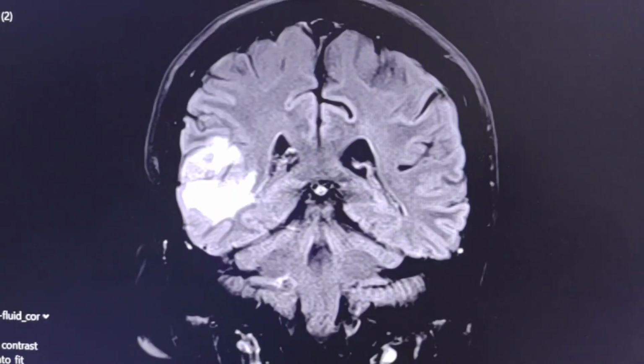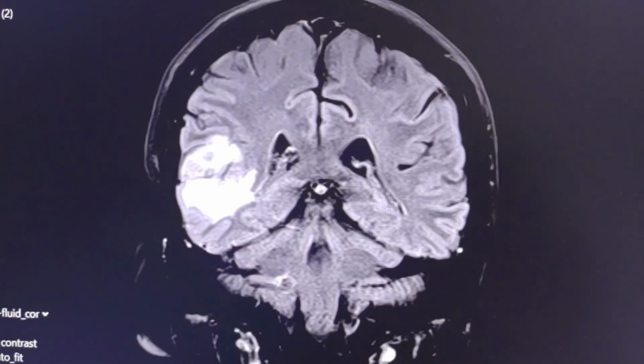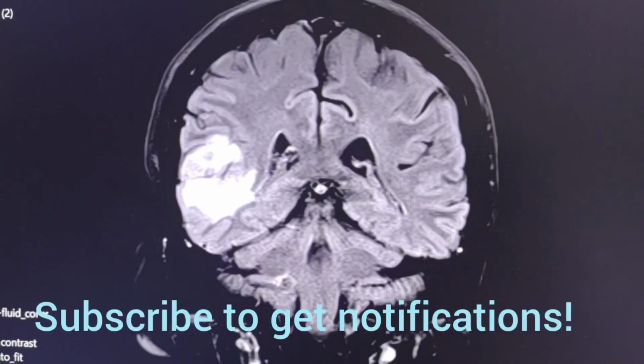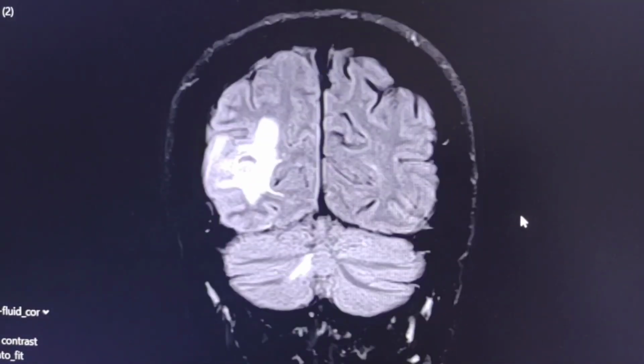57-year-old, with a history of HIV, AIDS patient, and known cerebral and miliary tuberculosis and multiple brain and spinal lesions. And he presented to the emergencies with a 3-day history of worsening dizziness, ataxia, nausea, and here is a previous MRI.